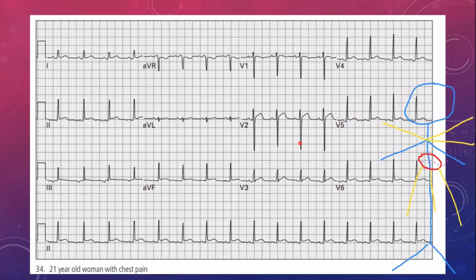And one of the others that you get is pericarditis. Okay, so what we're going to do is have a look at the differentials, and then we're going to come back here and try and think of what could be the most likely culprit in this case. All right. So let's have a look now.